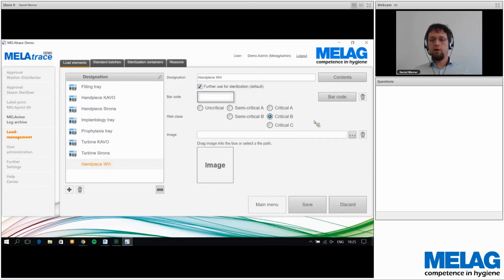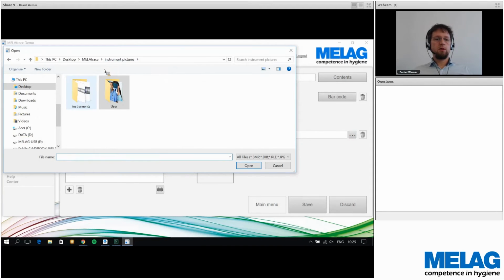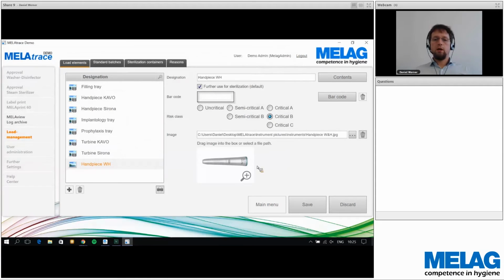and I can add a picture like you have seen before. Click here on the button, and now instrument pictures, instruments, and handpiece from W and H is here. Click on that picture, open, and don't forget to save. That's it.